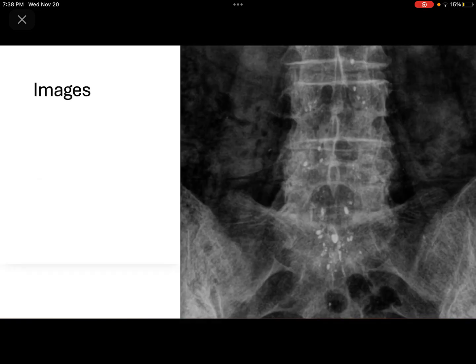This is a very bad image. It does not include all anatomy of interest. It also has no marker whatsoever. I don't know if it has blockage in the spinal canal since there's spots of contrast. I can only assume that there would be. However, it cut off the rest of the spine, so it's not a good diagnostic image to help us see if there's any blockage whatsoever.